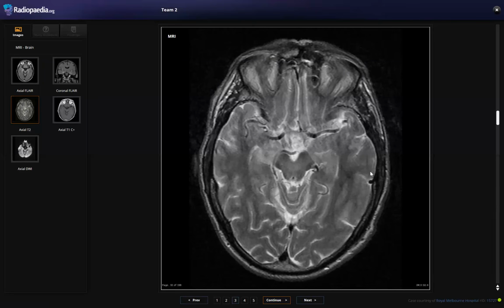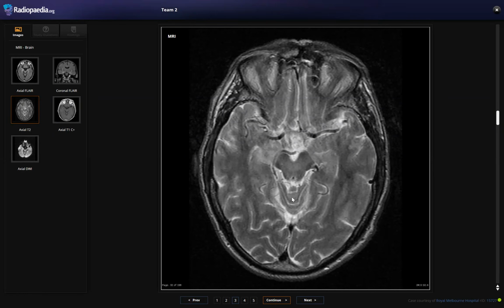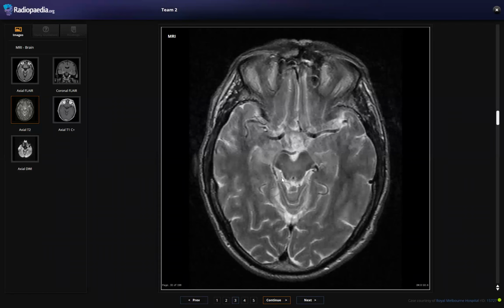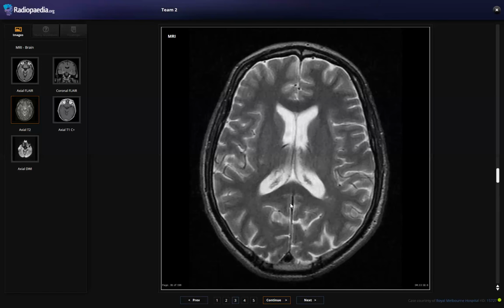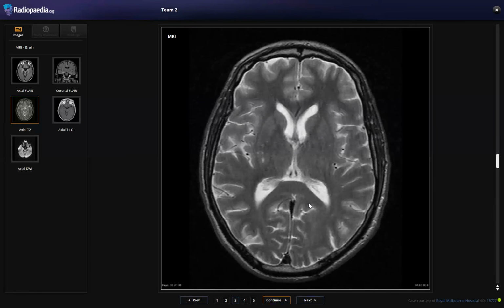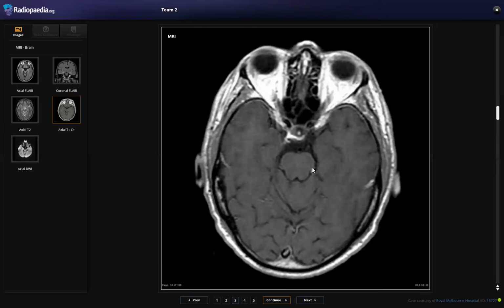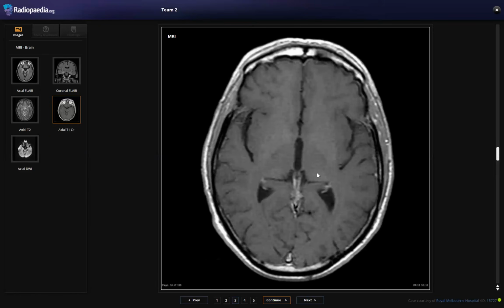Okay, so I will have a look at T2. T2 is also showing a T2 hyperintensity within the temporal lobes and also in the region of the cerebral sulci. And I don't see any other evidence of any brain parenchymal mass or any SOL, no midline shift, and no ventriculomegaly. I will go through the post-contrast images. The post-contrast images are showing no significant enhancement of these abnormalities.